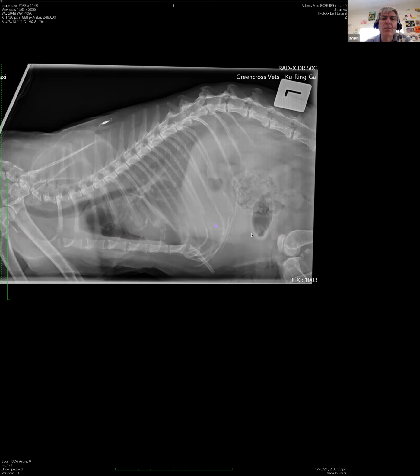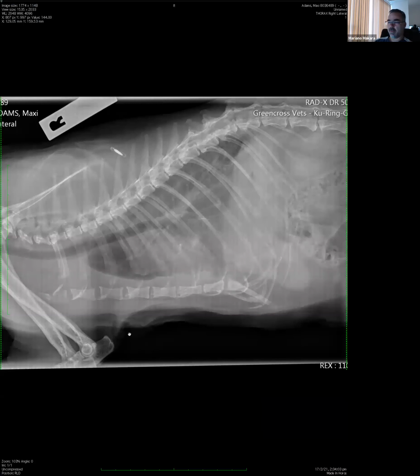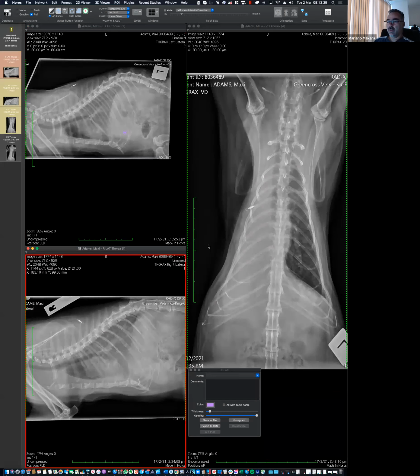So that is telling me that if I have a question mark, it's probably less likely for that border in the other projection to be the liver. Hopefully you could follow my reasoning: we have this structure, we don't know what it is. I think there's a little bit of gas in the left lateral projection, therefore we make it pylorus. And therefore we question that the liver is enlarged in the right lateral projection. That would be my thinking aloud about that finding.